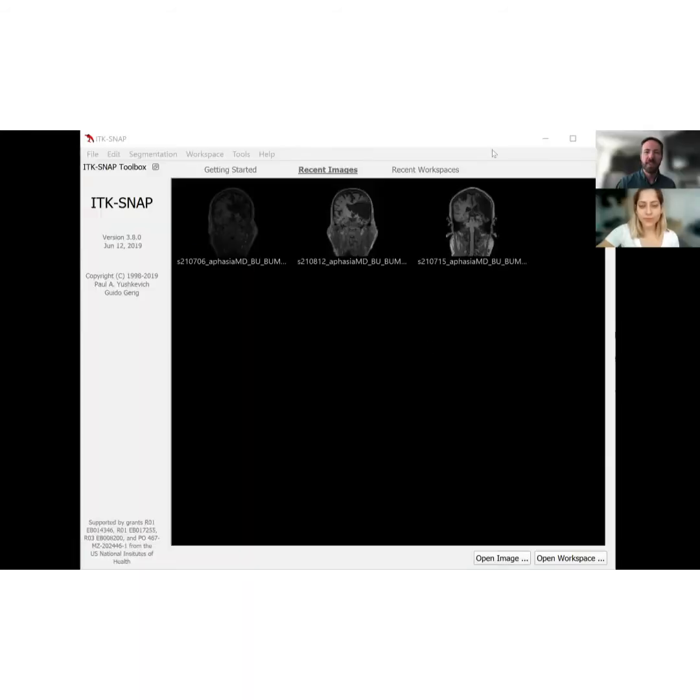Thank you, Tamar, for that great introduction to the topic. I will give a quick demonstration of how we use ITK-snap to segment lesions for our patients. Just to confirm, Tamar, you're seeing just my ITK-snap window? Yes, I do. Okay.